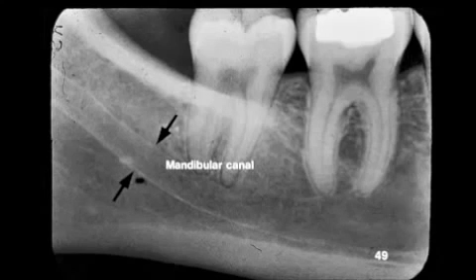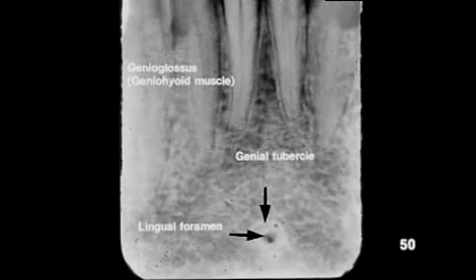Between these arrows is the mandibular canal. It is radiolucent. It has a white outline because it is surrounded by hard, compact cortical bone. Above the arrows, we see a bright white landmark. That is the external oblique line or ridge which we have observed previously. Below the mandibular canal is the lower border of the mandible. It is radiopaque and is also observed on this slide.